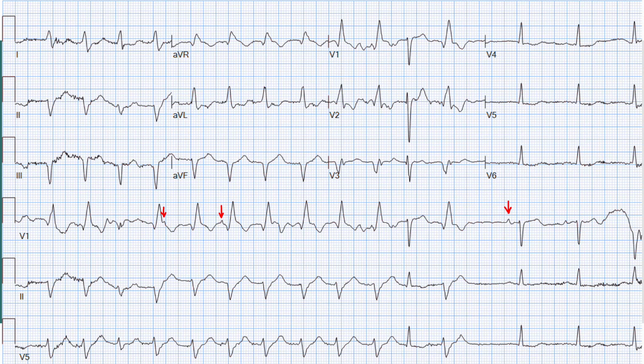Sinus rhythm is very good at marching on time. If these are true sinus P waves that are dissociated, then if I caliper out the next beat, taking that interval, it'll be right here. And as you can see, I do see a bump there in the ST segment that would represent a P wave. Looking back, I see another high-frequency deflection here, which is probably also a P wave. I often caliper out two of them and see if there is anything in between, to make sure we're not missing a faster atrial rhythm. In here we don't see anything because it's in the QRS, but here's a nice clean ST segment, and I certainly don't see any P wave there.